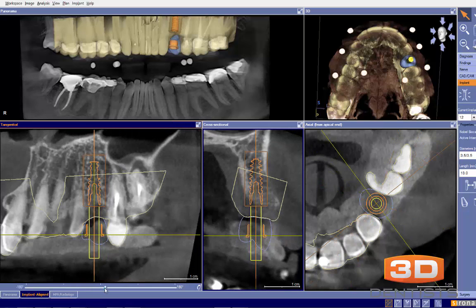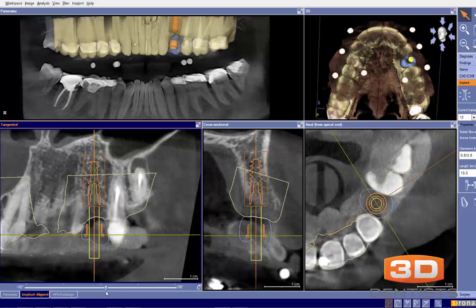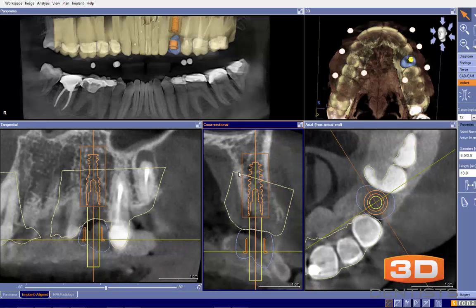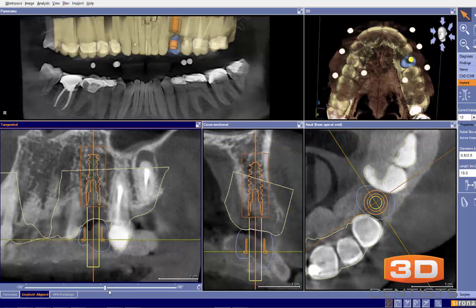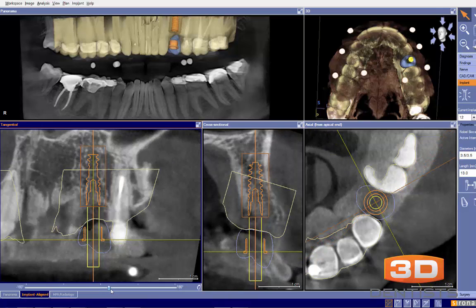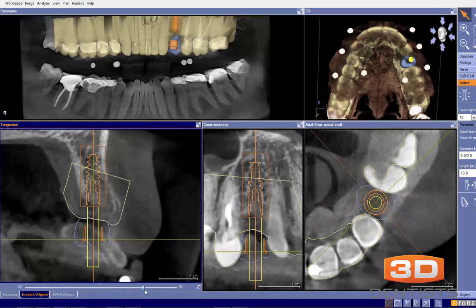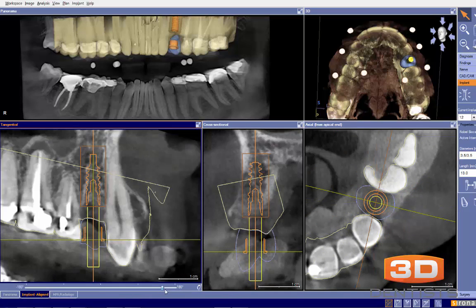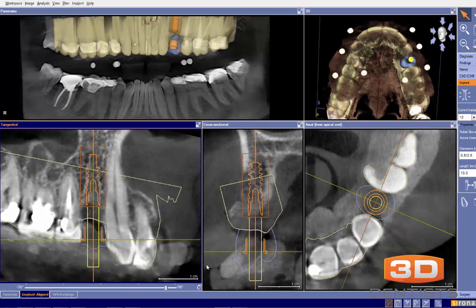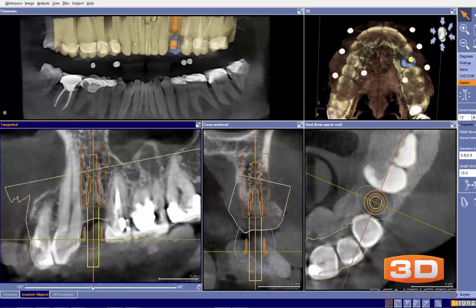As we go back through it, if we were just to look at it in this slice, it looks fantastic. All of that bone is right there. But when we go through here, as you can see, as we keep moving, right there it disappears. This is as we go backwards in our slicing 360 here.